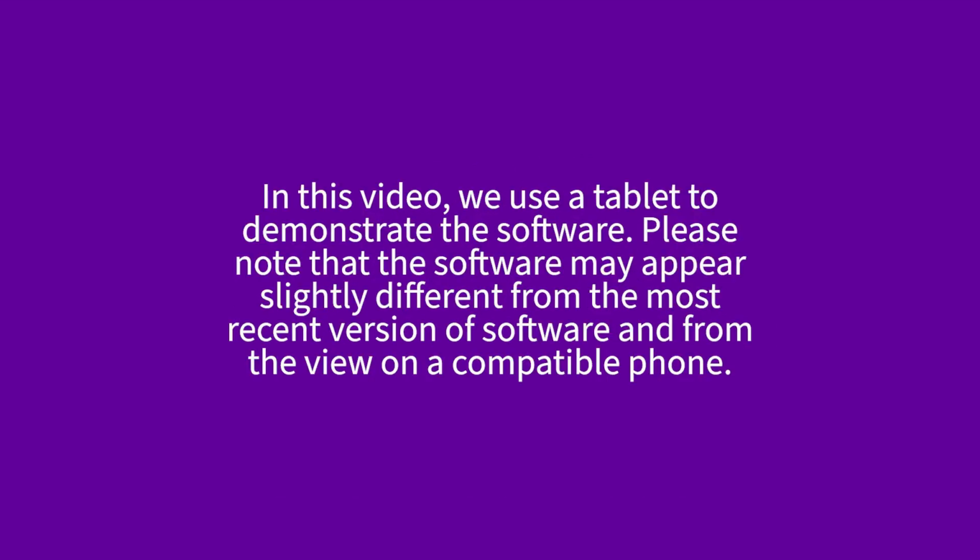In this video, we use a tablet to demonstrate the software. Please note that the software may appear slightly different from the most recent version of software and from the view on a compatible phone.